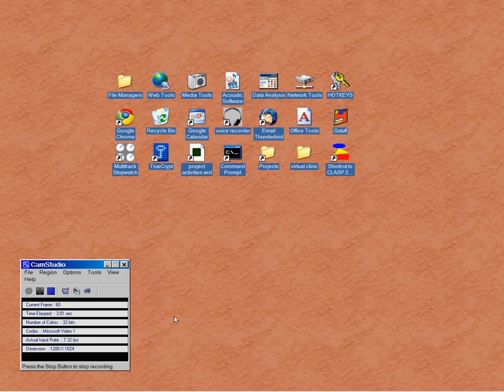Hi, and welcome to this instructional video designed to orient you to the Alvin2 voice recording software, which you'll be using to do data or voice sample collections as part of your voice diagnostic experience. Now, depending upon the computer you're using, all will probably have a shortcut to the voice recorder. Its icon is this gray box with a set of headphones in it.